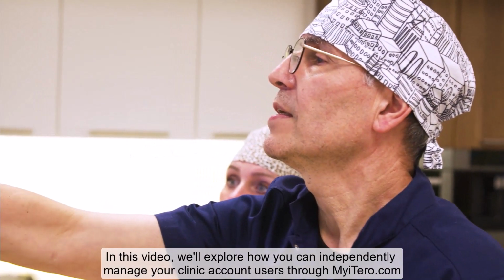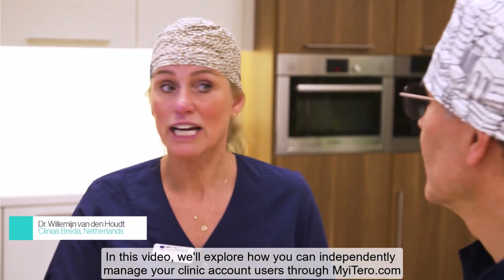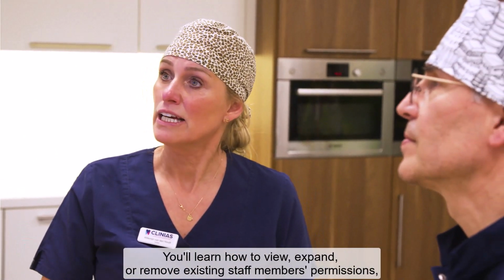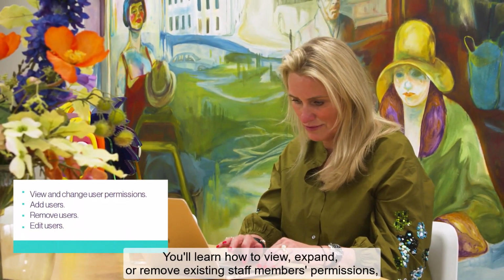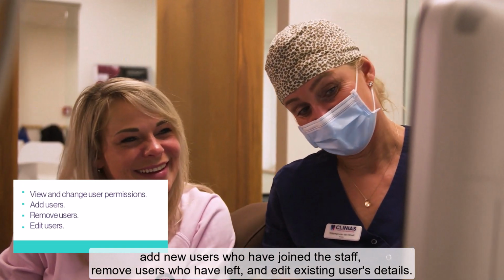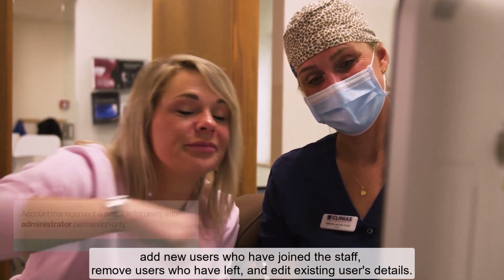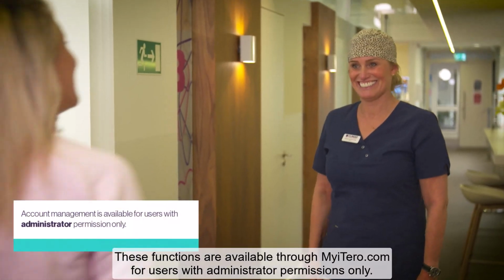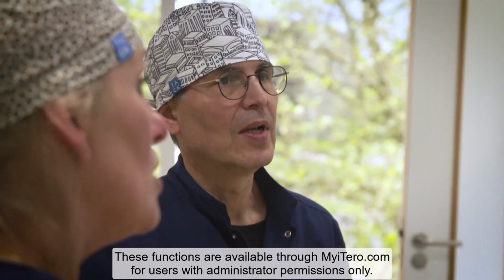In this video, we'll explore how you can independently manage your clinic account users through MyiTero.com. You'll learn how to view, expand, or remove existing staff members' permissions, add new users who have joined the staff, remove users who have left, and edit existing users' details. These functions are available through MyiTero.com for users with administrator permissions only.